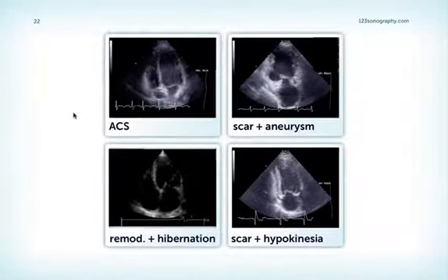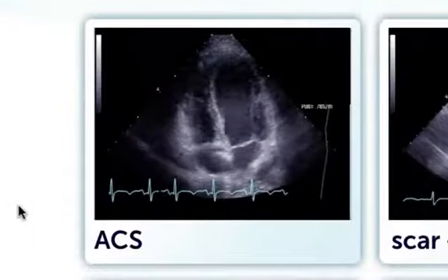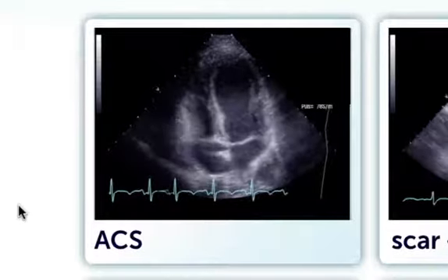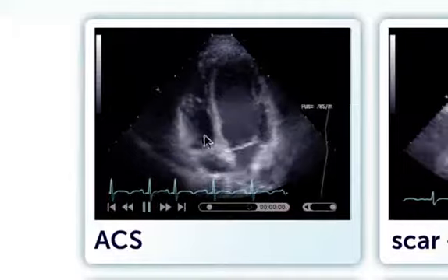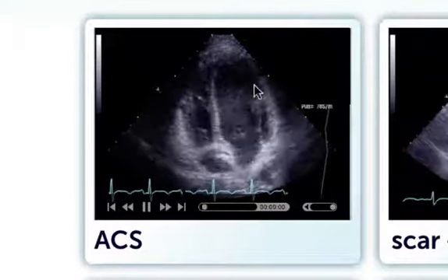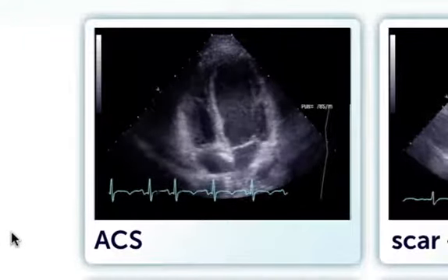Now here are some examples so you understand what the full power and potential of echocardiography is. On the left-hand side is a patient who came in with unspecific chest pain where we were not sure what the patient really had. The ECG was not very conclusive and we thought the patient actually had myocarditis. But when we performed echocardiography, we immediately saw this regional wall motion abnormality. The entire apex is akinetic. The wall thickness is preserved. So that brought us to the suspicion of acute coronary syndrome, which was documented by coronary angiography, and the patient was adequately treated.